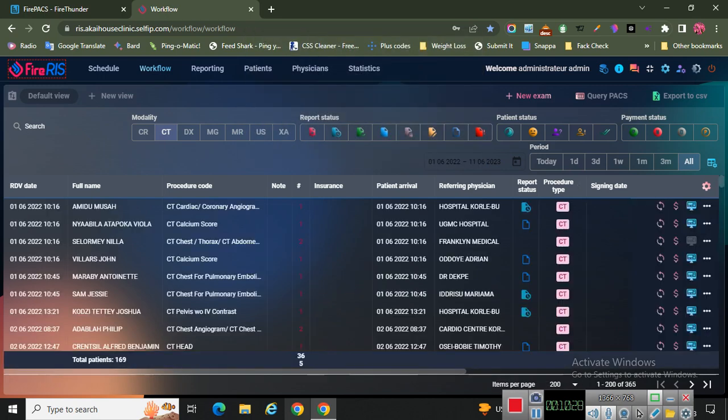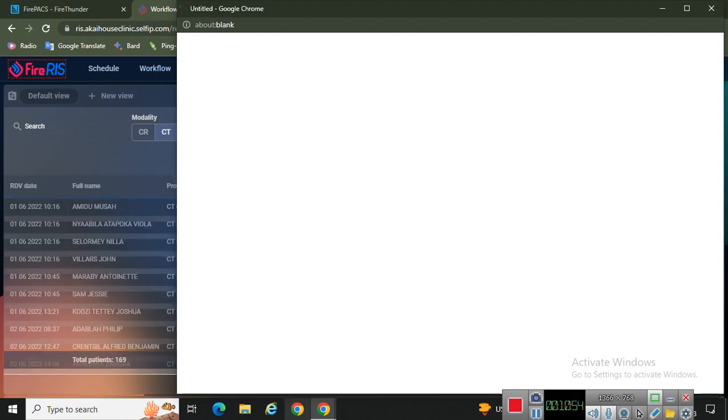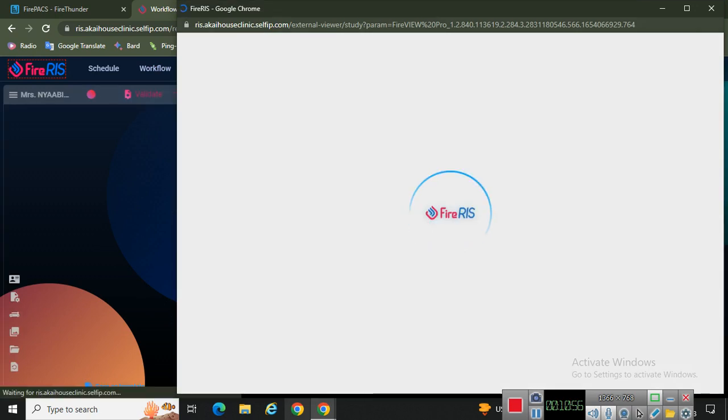All right. I don't just want a simple case like this one. Has some score. Okay. Let's see.